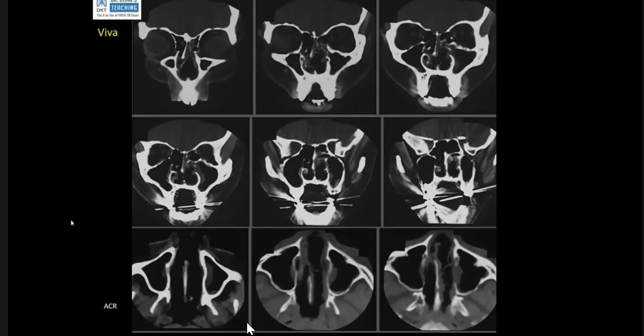There is evidence of prior surgery in the paranasal sinuses. There is nasal turbinectomy, upper and middle on the right side, and uncinectomy. Could be a prior sinonasal polyp, chronic sinonasal pathology for which the patient was operated.